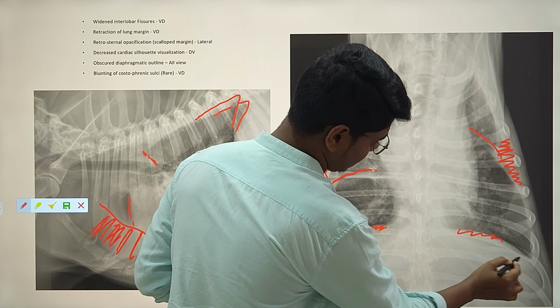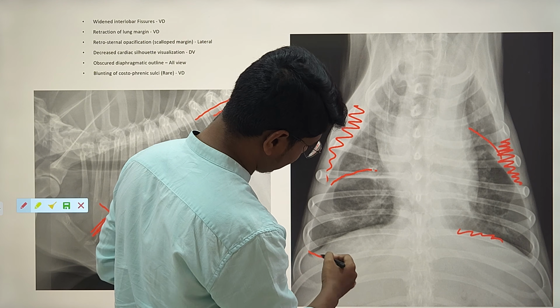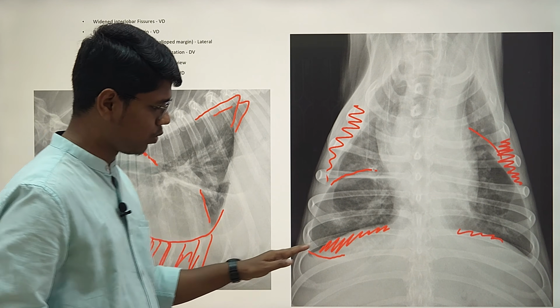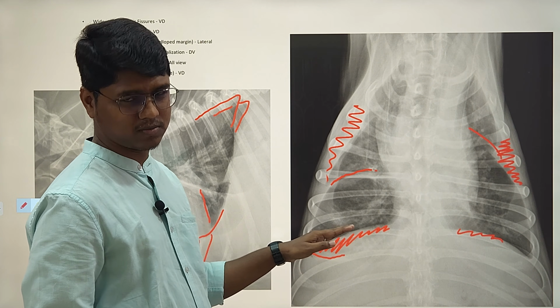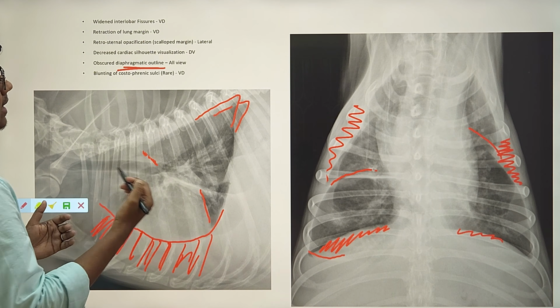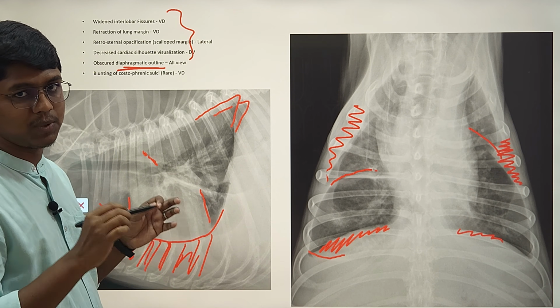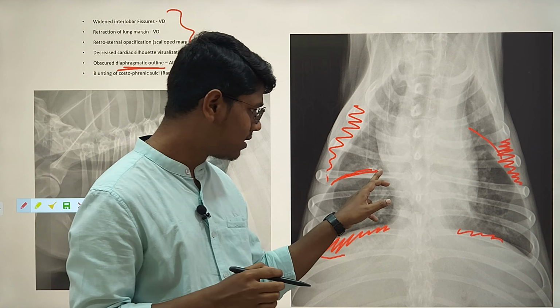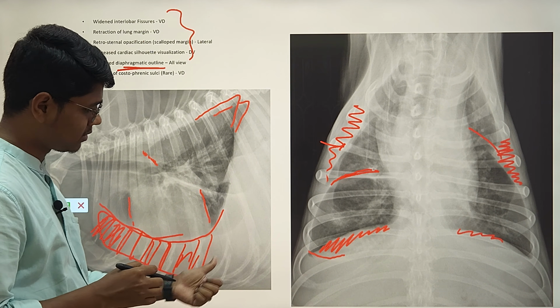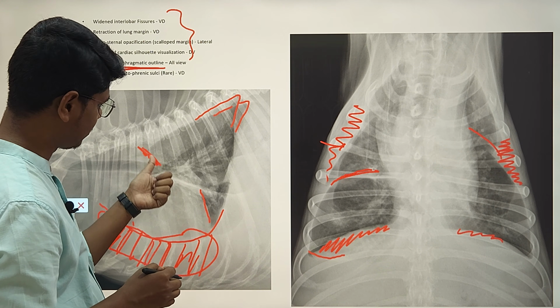this particular region. This is kind of fine, but in this particular region, you can see the lungs have extended up to this one, but this is basically the slight opaqueness of the diaphragm. But I told you, in order of preference, it is slightly less. These are the more prominent signs of pleural effusion: the fissure, the lung retraction, and in lateral view the opacification of the retrosternal space, and you will find the fissures in lateral also, especially this one.